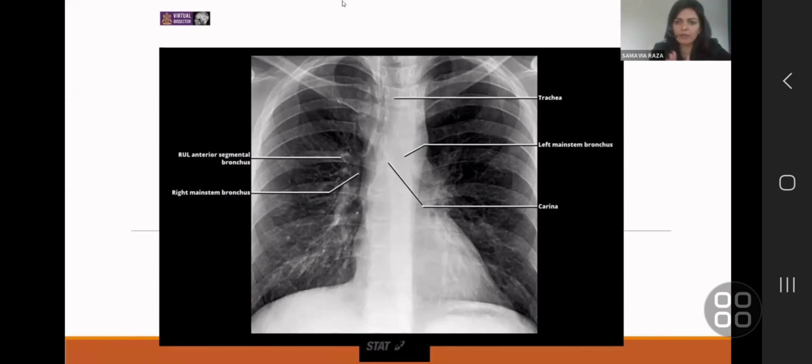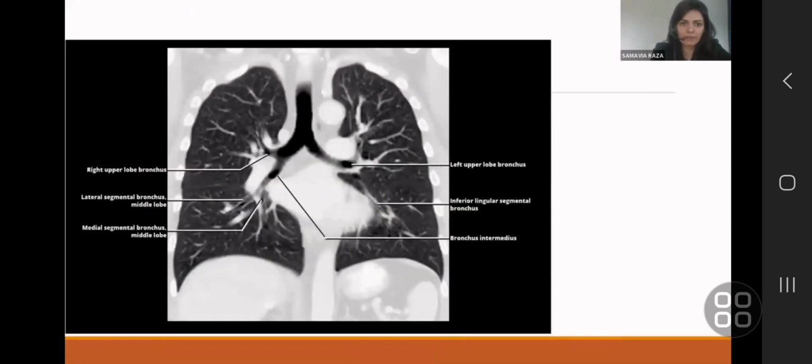Think of the shape of the trachea, and if you think the size is abnormal, look for a reason. If you can't find a reason, don't call it. The very rare pathological syndromes or causes that cause primary tracheal or bronchial wall dilatation are very, very rare. It is a rare diagnosis that you won't be seeing very commonly. And that's the same view on a coronal CT scan.